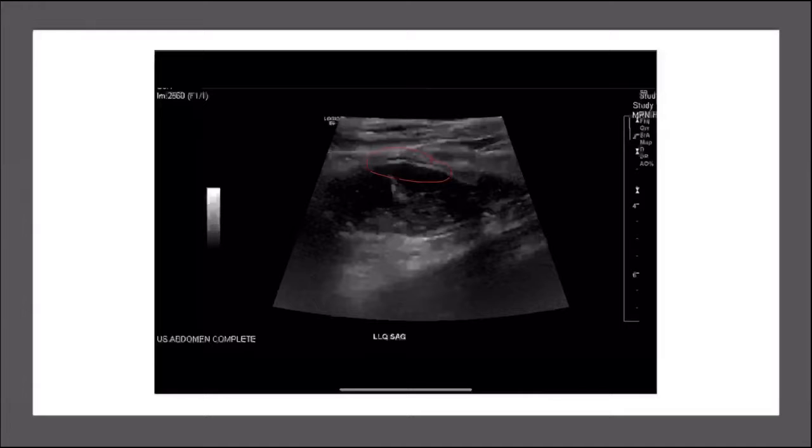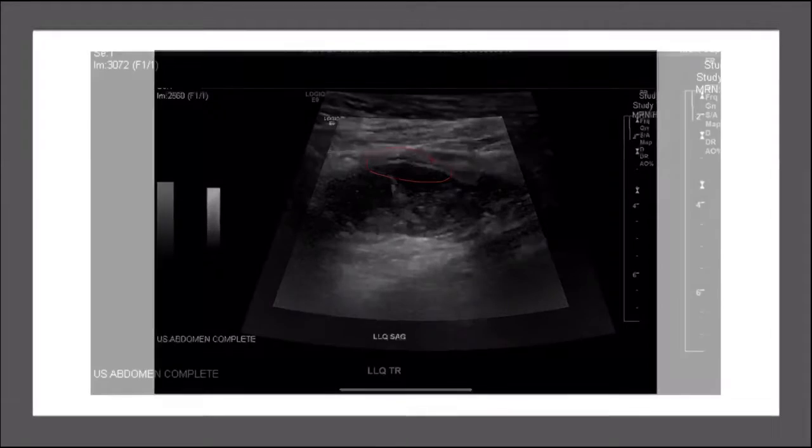I found interesting. In this image, it's the same image as before, but the part that I circled there is where the radiologist actually explained to me that he decided that this was bowel and wasn't a mass because he was able to blow it up and show the different layers of the bowel and exactly how he determined that this was ileus and was not a mass.